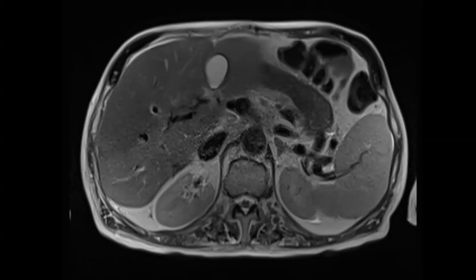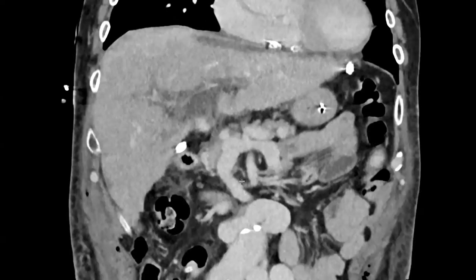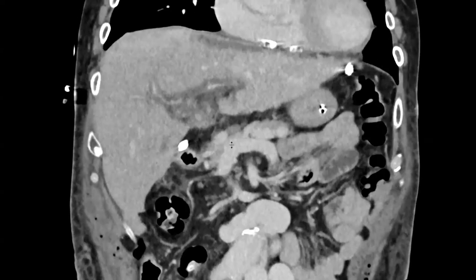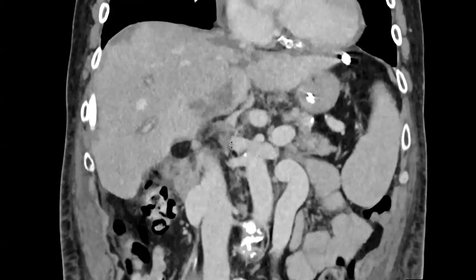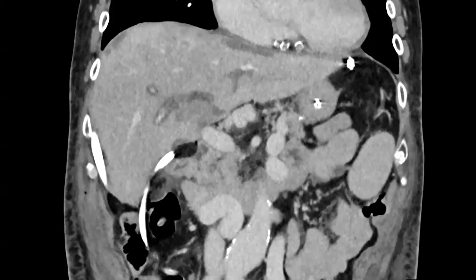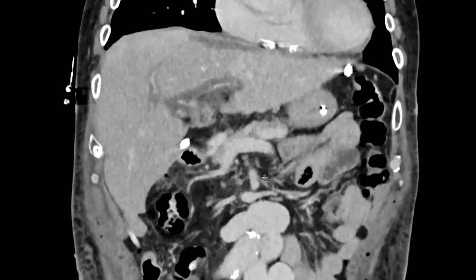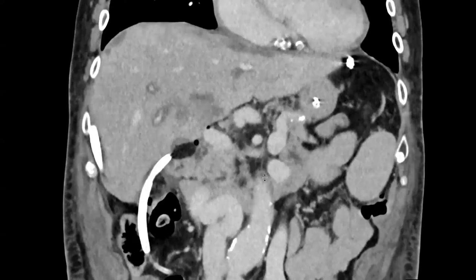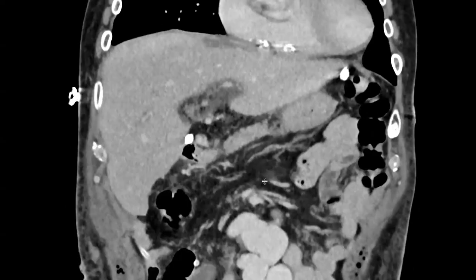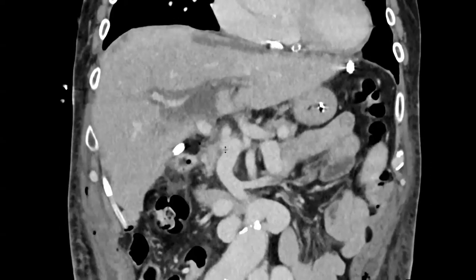Here, let me see if I can. Well, the portal vein was, are you okay saying before, go ahead. Biliopathy from portal vein transformation, is that what you're saying? In that case, you would see flow voids and collateral vessels, although you can get some soft tissue. Wait, this is at the same time frame? This is immediate post-transplant. The MRI that I showed you is about 3 months after transplant.